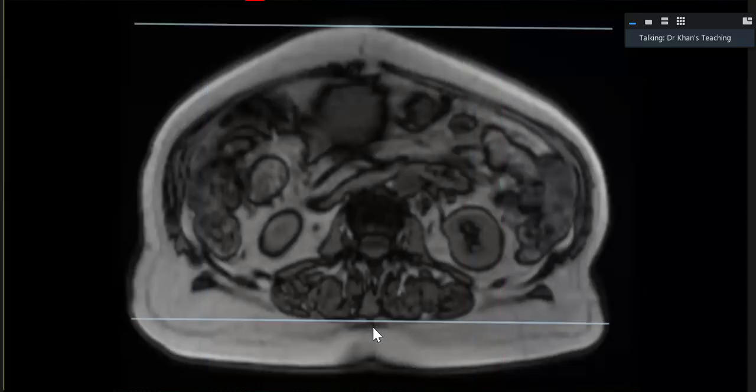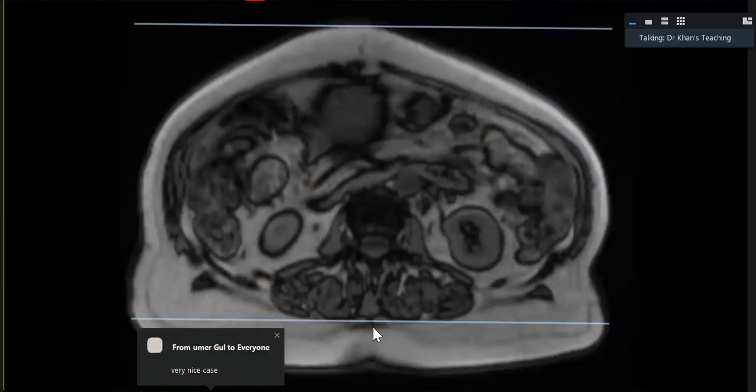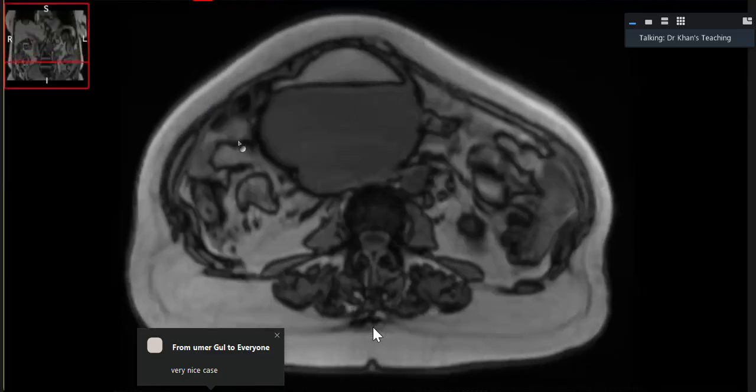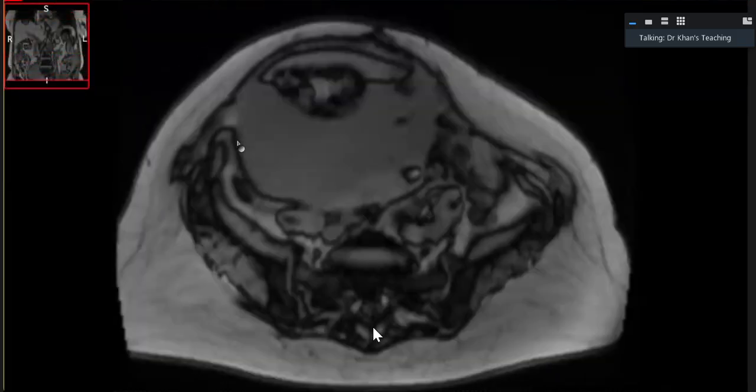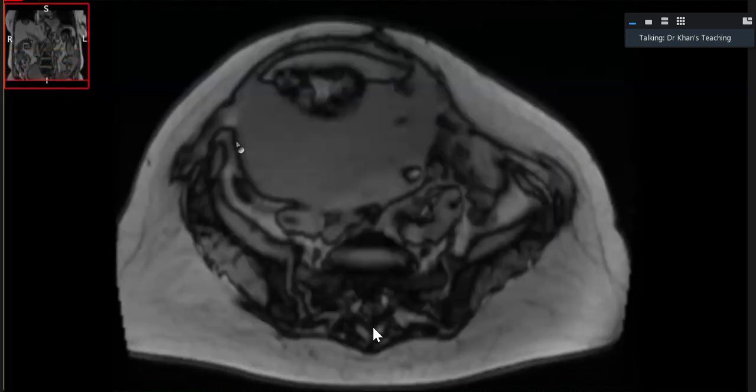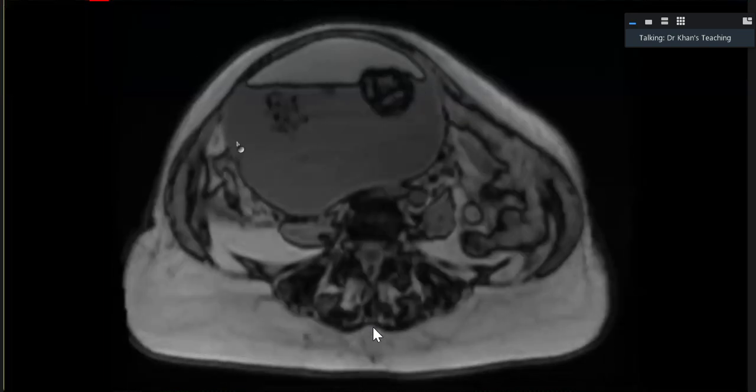Having said that, the candidate did well. We picked up multiple features and some other features. Let me take you through that. So, terminology-wise, these days it is known as immature teratoma. Mature teratoma, the word dermoid, is now technically, instead of using the word dermoid, you should use the word mature teratoma. And this is an immature teratoma. In this age group, it is very rare, but this is what happened.